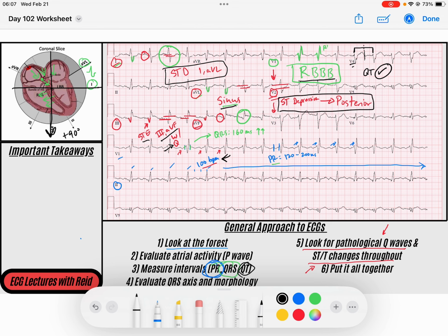And so this patient was urgently taken to the cath lab. They were actually found to have an occlusion of the first obtuse marginal, which is actually a distal branch of the left circumflex. And this branch, the left circumflex, can wrap around the heart posteriorly and also extend inferiorly, which is likely why we see some of that inferior and posterior involvement.